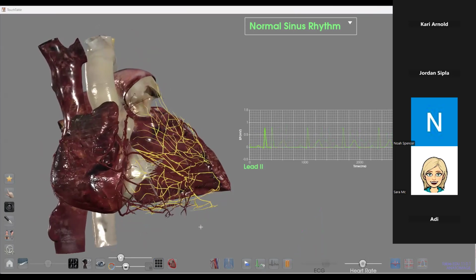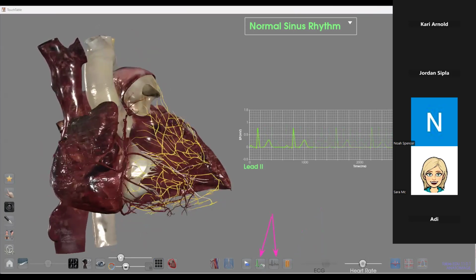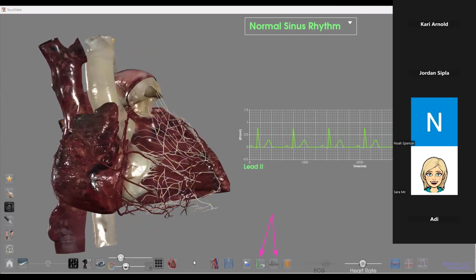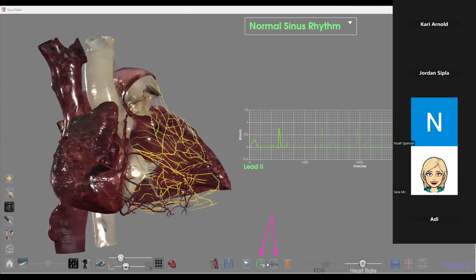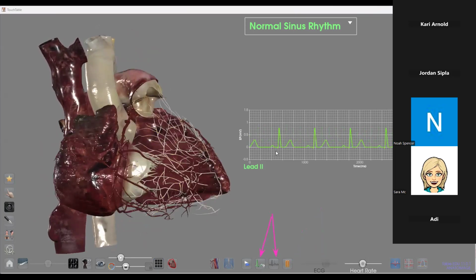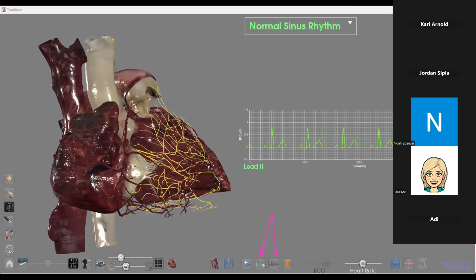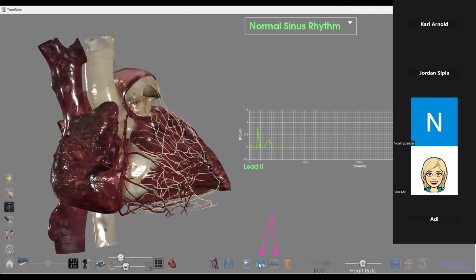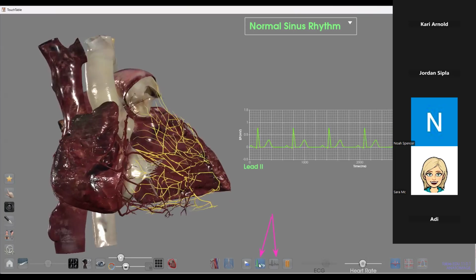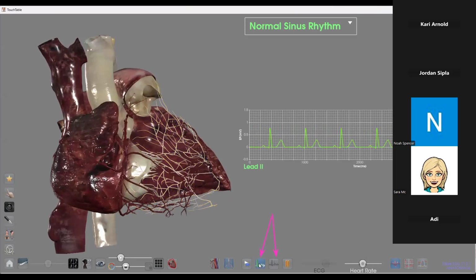Moving further to the left from that, we have some kind of ECG view icons. Now, if you're happy with the ECG the way it is, you could just not worry about these. There's just a couple of different ways to view an ECG. So right now we're viewing it in this kind of resetting mode where our ECG is going to the end and then it's starting over. If we toggle on this ECG scroll, in table 9 this was called ECG scroll, or in table 10, you'll see the ECG is continuing to scroll.